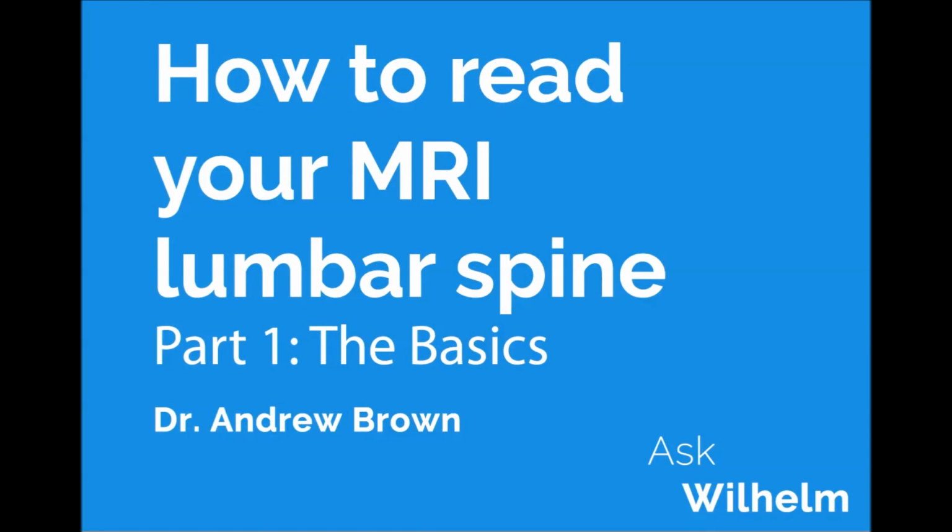So that's it for part 1 of this 6-part series. We've gone through how to install a DICOM viewer, and we went through some of the basics of lumbar MR imaging. In the next segment, we'll talk about the intervertebral discs and some of the pathology that happens there.